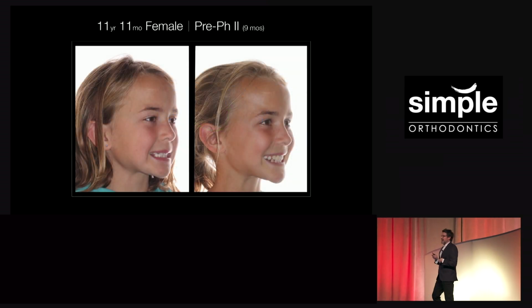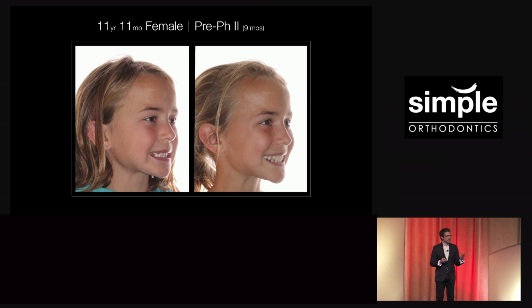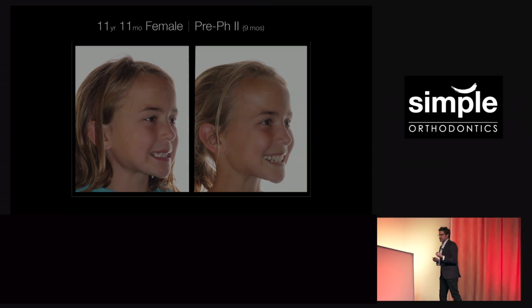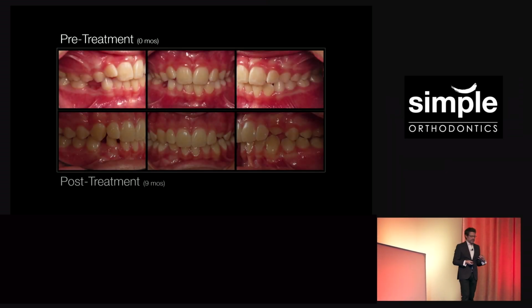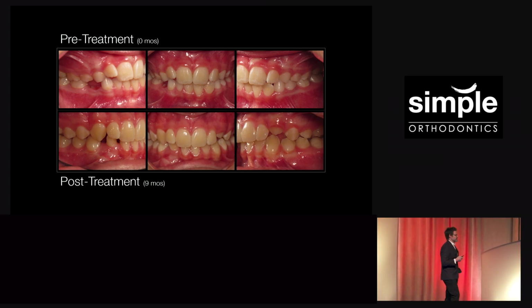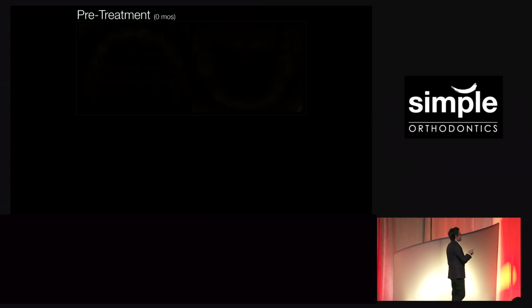So Annabelle had 9 months of early phase 1 orthodontics. I'm going to share with you a little bit more about what we do for phase 1. But here's where we got her to in 9 months. All I wanted to do is get her expanded because she was narrow in the maxilla. And I wanted to resolve this transposition of the canine and the lateral. Here's what she looks like on the occlusal.